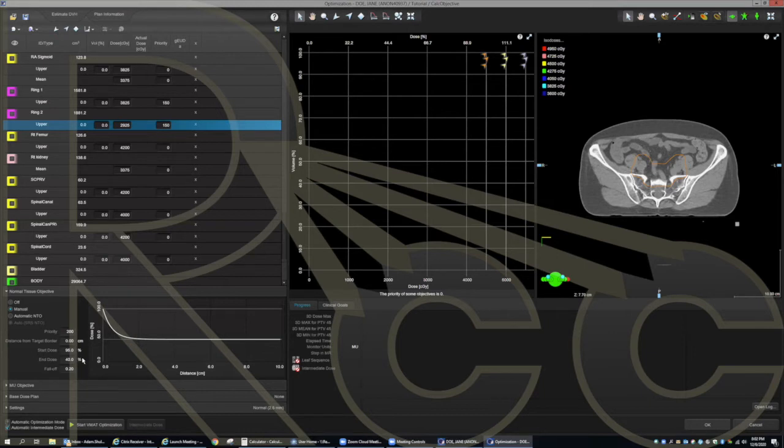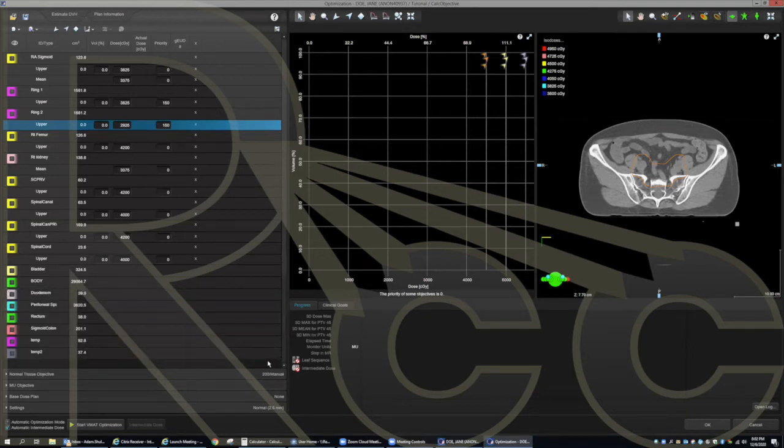Okay, quick question, Adam, this is great. I like the idea that you start with just the PTVs and the rings, because that's going to make sure that you're covering the PTVs without any other thing. But you're using the PTVs and also the PTV max, both. Yep.